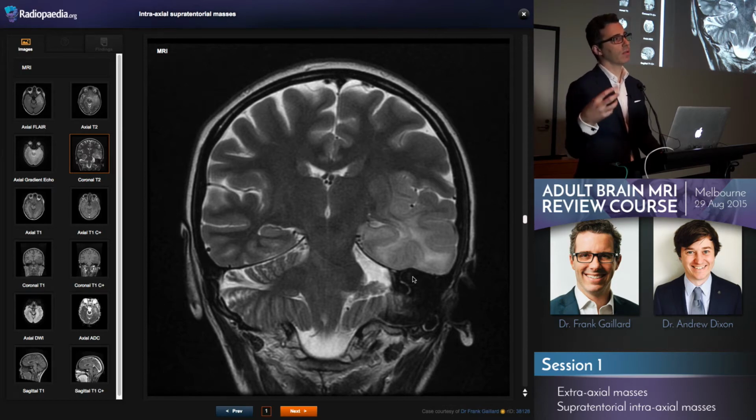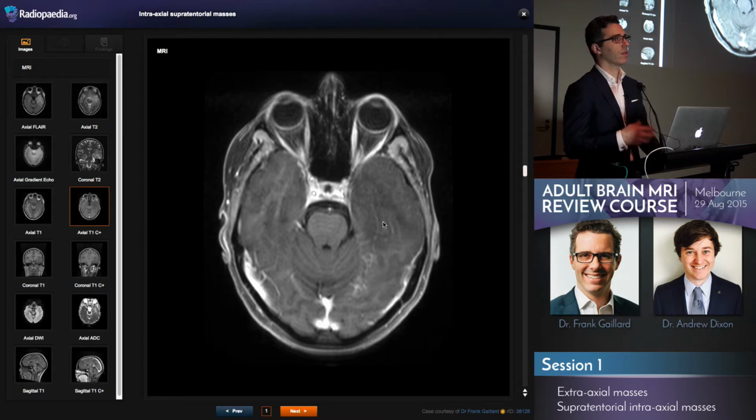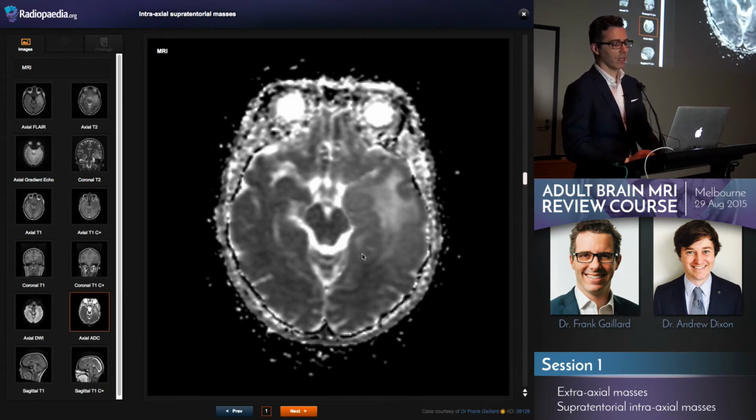Focal cortical dysplasia, a large area of focal cortical dysplasia, is worth considering, and the presentation will be important in terms of limbic encephalitis or HSV encephalitis. They don't enhance because they have a nicely intact blood-brain barrier and don't have a lot of neovascularity. And in terms of their diffusion, we really don't see very much restricted, mostly facilitated, so brighter on ADC.